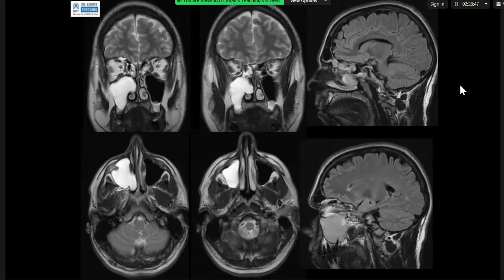But actually, inverted papilloma is usually coming from the ethmoid. It has a cerebriform pattern, and it comes from the ethmoid coming down. So one thing that would be helpful is to see if there is any hyperostosis focally. And the other thing, could that be just a polyp? Can I stop you there? Look at the signal. It is completely fluid signal, right? So now you don't speak.